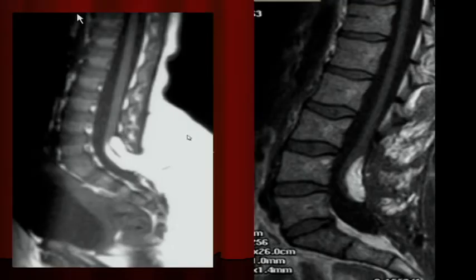So here's a patient, and this is the MRI, and this is T1, and this is increased signal. So what is this probably going to be? It's not contrast. They didn't give contrast. Fat. And you see a tethered cord? The cord goes all the way down here. The cord should stop at L2, 3, definitely not go below L3. And here we have an opening back here.